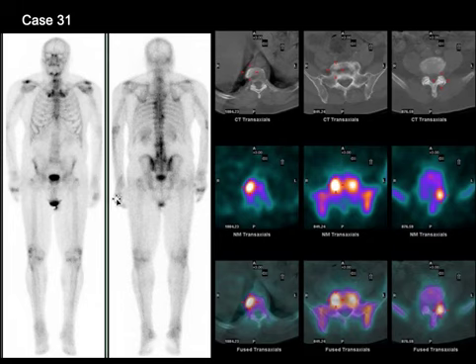Another great utility of doing a SPECT CT along with a whole body bone scan is when you run into a situation like this, where on the posterior view there are multiple foci of increased uptake, and these foci could be from metastatic disease, but they are slightly laterally located, so could be from degenerative disease, and you're not sure. So you need some kind of morphological correlation. The best thing to do is to do a SPECT CT.